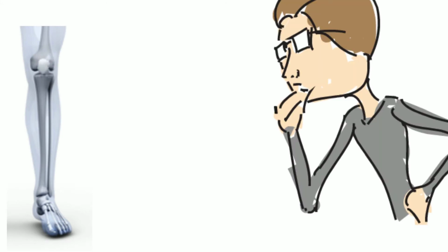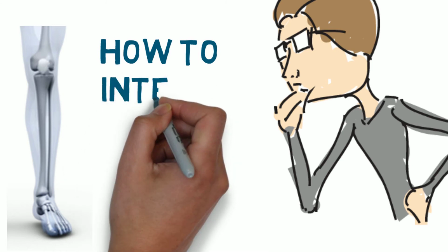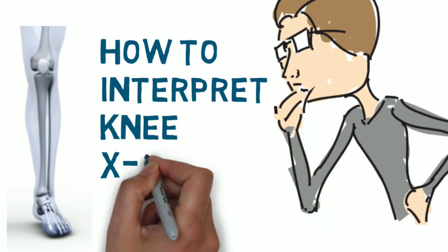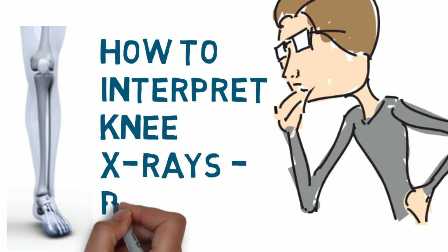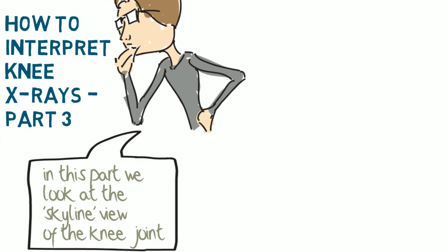Welcome to this third part in our series on how to interpret knee X-rays. In part 1 we discussed the knee X-ray from the front, that's the AP view, and in part 2 we discussed the knee X-ray from the side, that is the lateral view. In this particular part we're going to talk about a special view called the Skyline view.